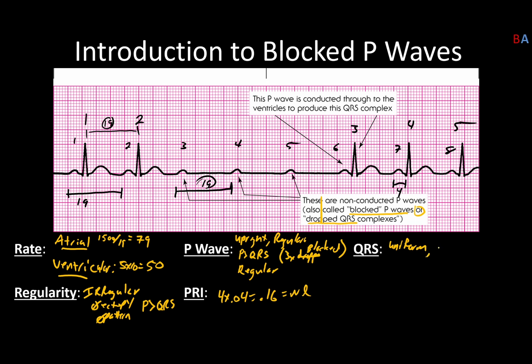They've got a tiny little Q wave, a tiny little S, and I will say that I have 3 dropped QRS waves. And those dropped ones are, of course, right here, and right here.